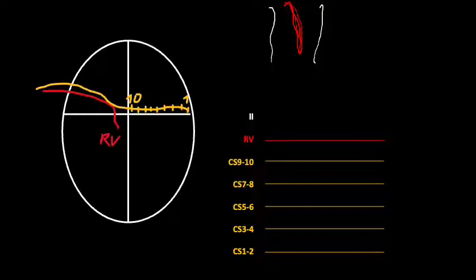So when we start pacing with the smaller voltage, we just pace this area closer to the endocardium and we don't pace the bundle of His. So in this case the QRS complexes are quite wide, the same as the typical normal ventricular pacing.